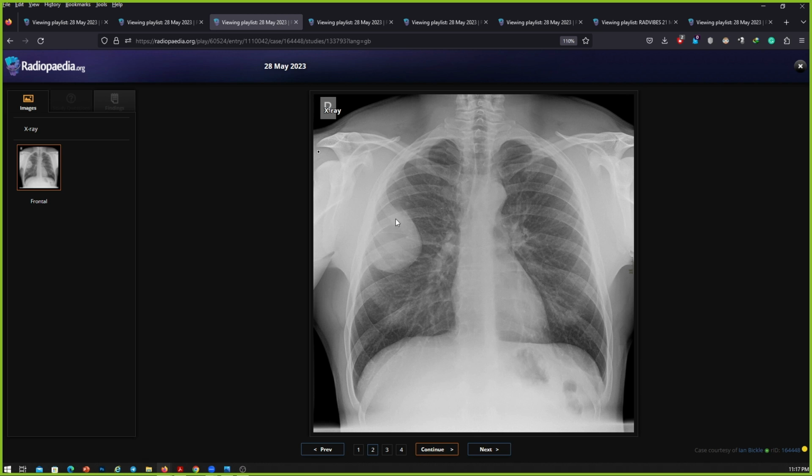Okay, so you described it well, but I would not support the diagnosis of mesothelioma with this particular lesion. If the thickening was rather circumferential or maybe more than this, but this is quite a focal globular kind of a mass. So I have not seen such a mesothelioma. It is very rare to get a focal kind of a lesion in a mesothelioma like this.